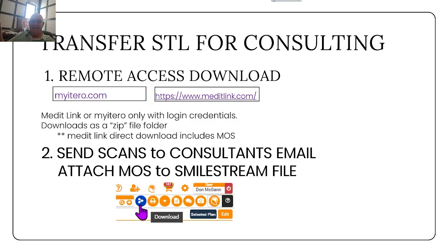The easier way, without all these transfers, of course, is just to scan directly into Medit Link, as I said before.